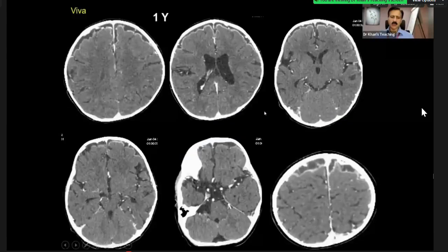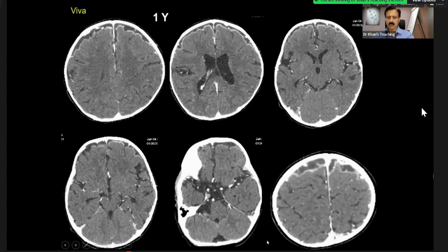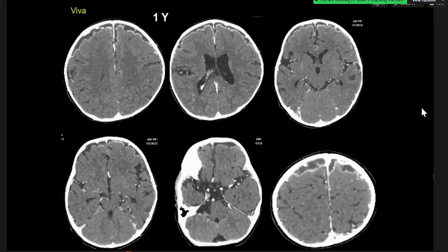Can you see a CT scan on your screen? Yeah. So over to you. This patient, the history is 1 year and not well, fever and things like that. So I've got axial slices through a 1-year-old's brain who is generally unwell with fever. They are contrast enhanced.